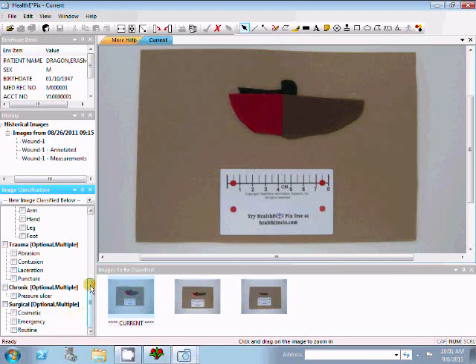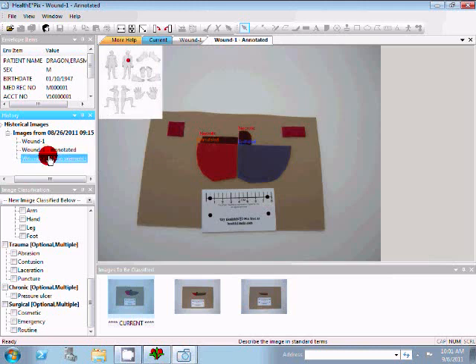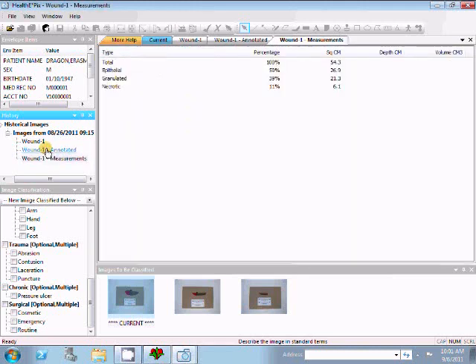In addition to the checkboxes, there's a drop list that allows you to indicate that the image is the same as one that has already been classified. For example, if I click in the History pane, I can view images for this patient from past visits. We always maintain the original picture along with any annotations to the pictures. In addition, you'll note that there are measurements from previous images. I'll cover annotations and measurements in a bit.